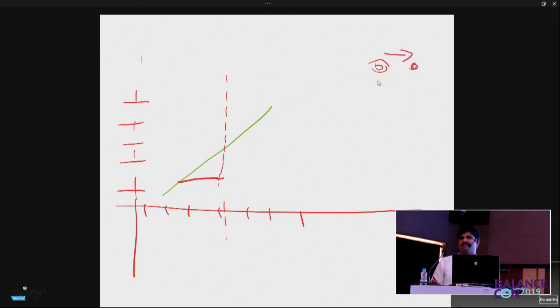The eye is looking somewhere here, whereas the target has already crossed this point. It is almost here. Now if this eye is not capable of a slow movement and it was not able to keep pace with the target, what will it do now? It will now try to make one fast movement and try to reach the same place. This is the place. Correct?